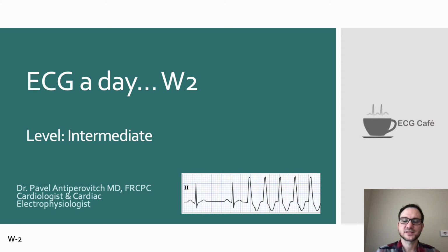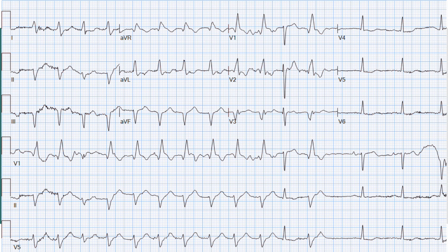Here we'll go through a single ECG and the discussion will be at an intermediate level. Here is the ECG, and you can go ahead and pause the video at this point and see if you can interpret this ECG yourself before seeing the solution.